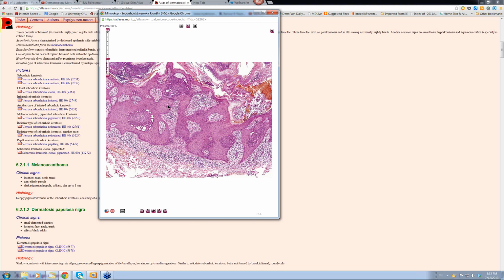Sometimes there's glycogen in these, and that's what gives them that lighter color. This has a sort of reticulated pattern as well. This is all thick keratin on the surface of this lesion. There's possibly a little bit of bleeding into this as well with that orange color. This is all intraepidermal. Here there's a lot of inflammatory reaction. So this is an inflamed clonal seborrhoeic keratosis.